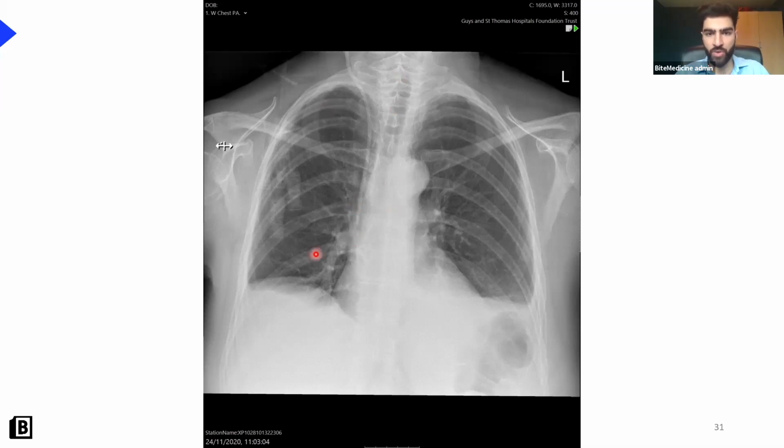I can't see any focal lesions in the lungs, but when we get to the heart, we've lost the inferior borders of the heart. We can't quite make out that right heart border or that left apical border. And we've lost that nice rounded contour of the hemidiaphragms. There's blunting of the costophrenic angles on both sides. So there's a problem on both sides of the lungs.